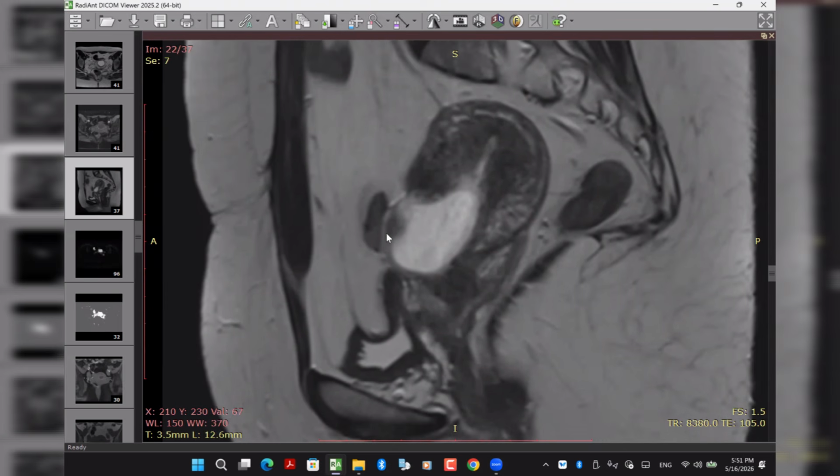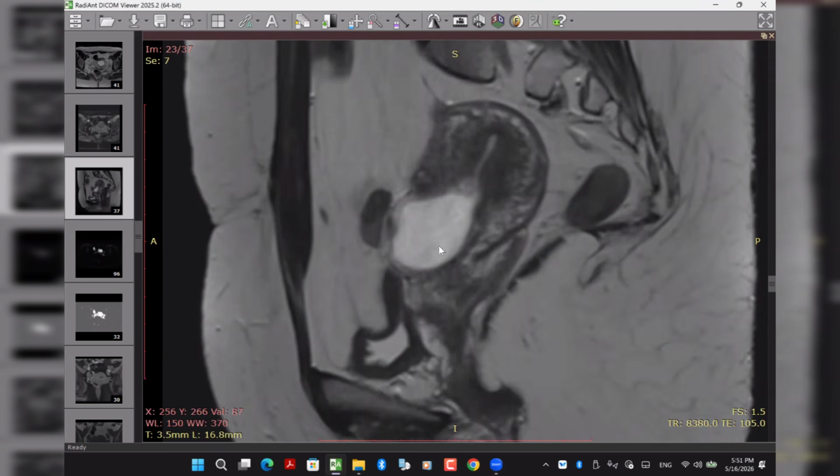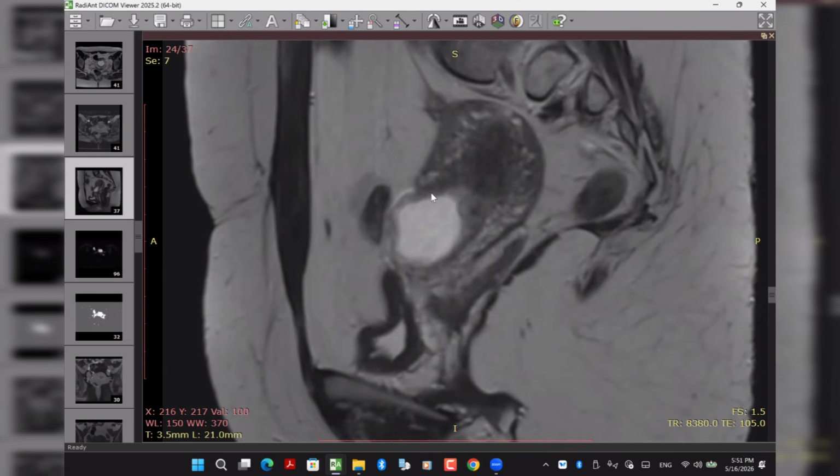Excellent. And this is the gestational sac, by the way, and it will not enhance. The thing that will enhance is this one. This is the decidual reaction surrounding it, and this is characteristic for early pregnancy. You can see it here. Yes, this is the decidual reaction.